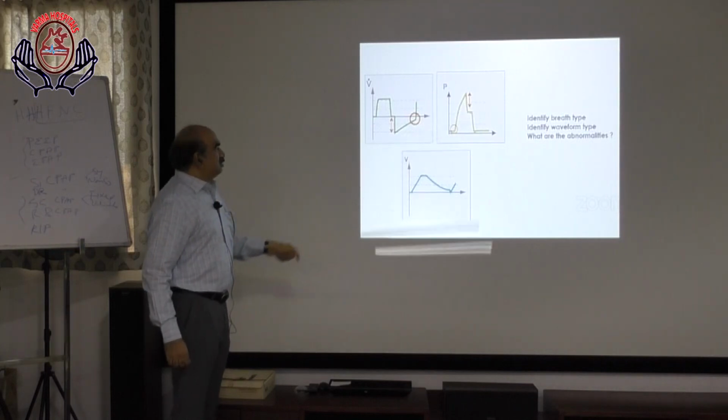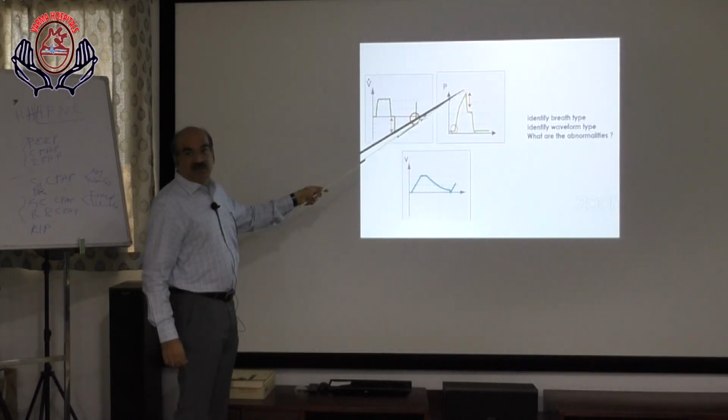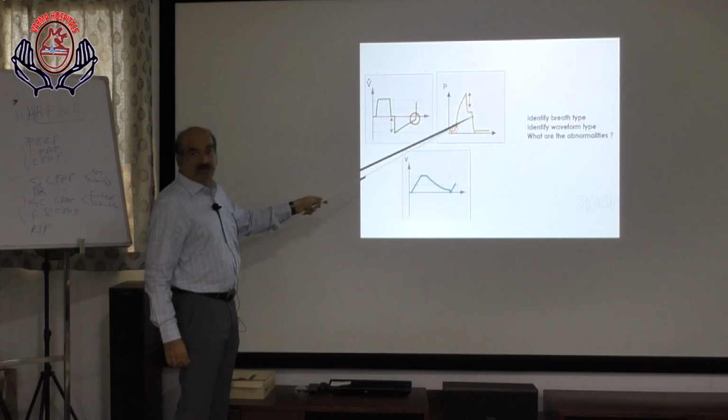This is PIP, peak inspiratory pressure. This is plateau pressure. PIP is increased. Yeah, increased trans airway pressure.